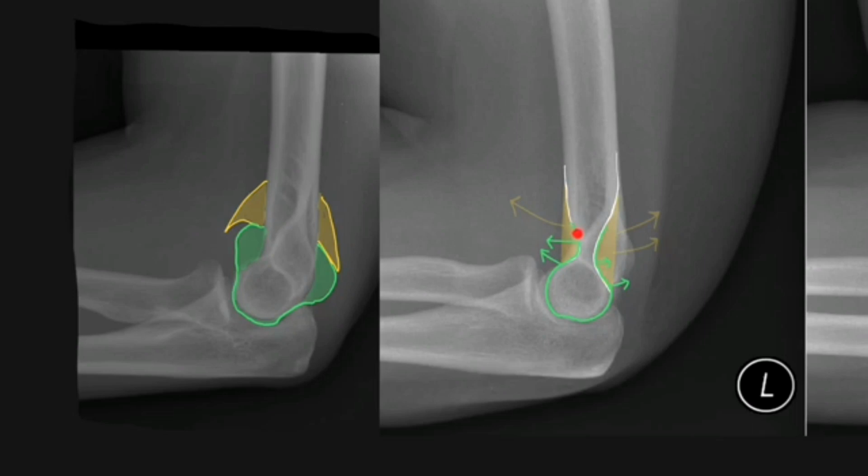When you get a joint effusion, the capsule, which is demonstrated as this green line, gets pushed anteriorly in the front and posteriorly at the back, and the fat pad moves anteriorly and posteriorly respectively. And as the fat pad moves away from the line of the cortex, it then becomes visible on the radiograph. The anterior fat pad is already visible on the radiograph, but what happens is it becomes a little more steep from its original shallow position, and this is nicely demonstrated by the diagram here on the left.